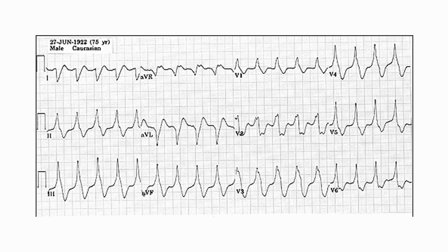So this is classical ventricular tachycardia. Again, if there is a pulse, the patient gets synchronized cardioversion. If there is no pulse, the patient gets defibrillation.